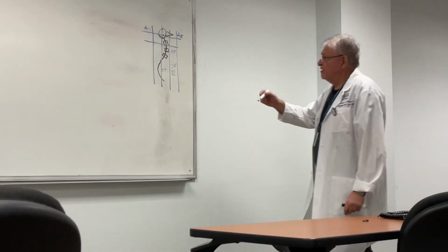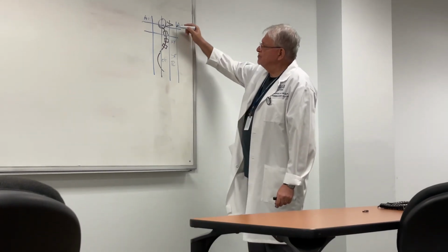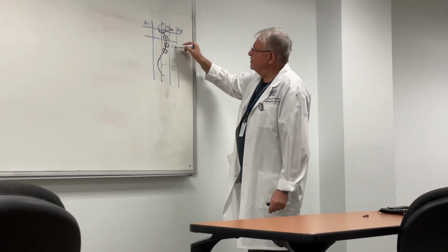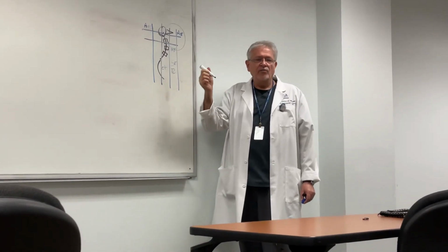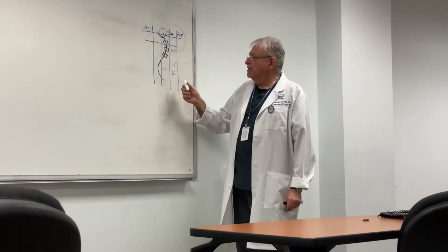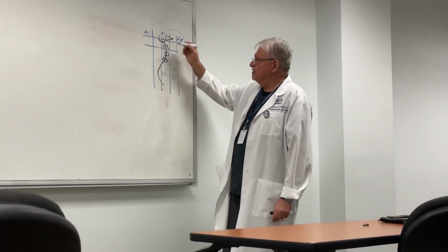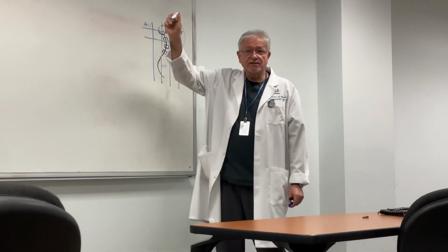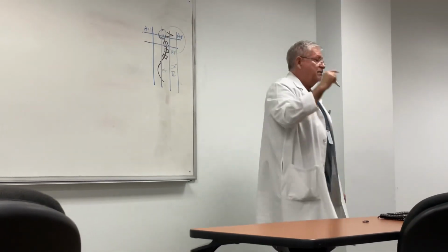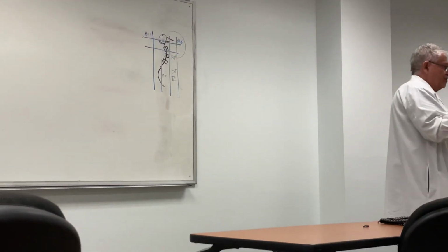So because I started here, I'm doing soft tissues. I'm not so much interested in the facial skeleton because we're not dentists. Our emphasis is in the spine, right? But I'm responsible for everything on the film. So soft tissues will be included. And I've sort of put something in here called a sella. If you see the sella, do you have to evaluate it? Yes, so it needs to be part of your search pattern.